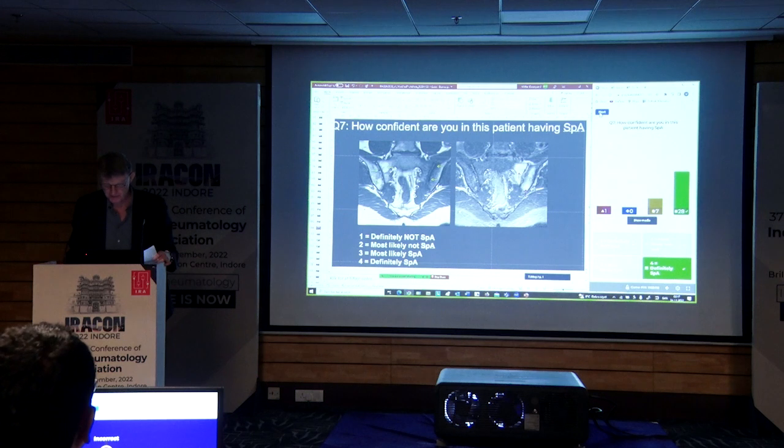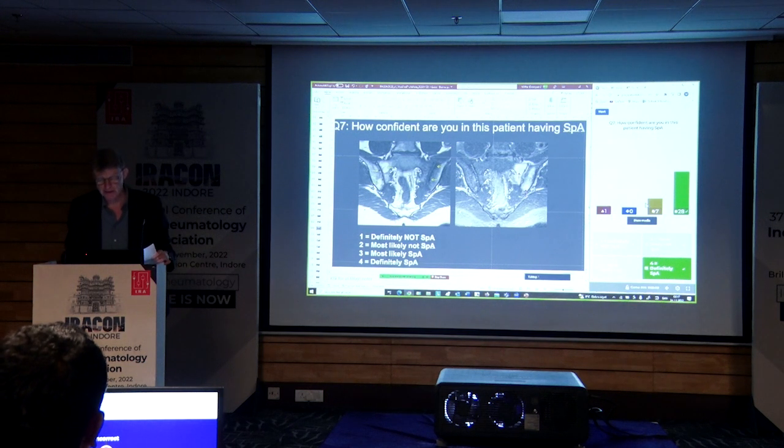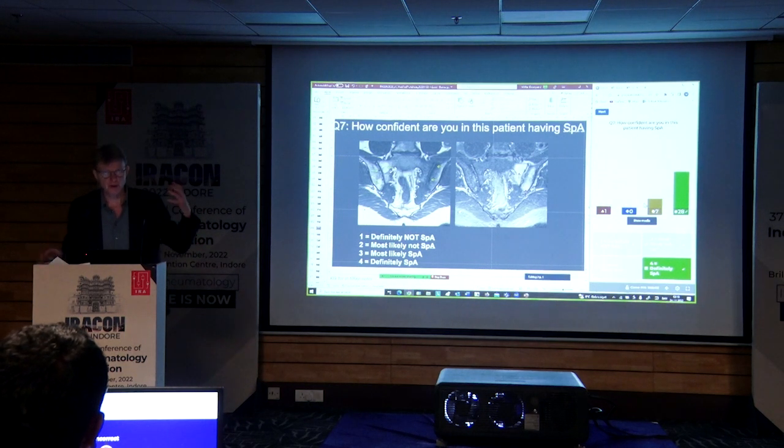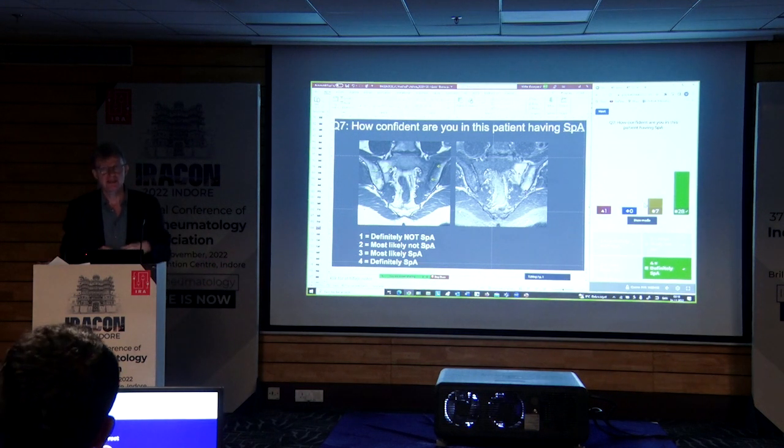The patient had actual SPA, and also most of you definitely said SPA, which I also think is correct based on the fact that you have the real good clinical history, you have both obvious inflammatory changes and you have structural changes. So you couldn't really have more, I would say. So therefore this is actually SPA.